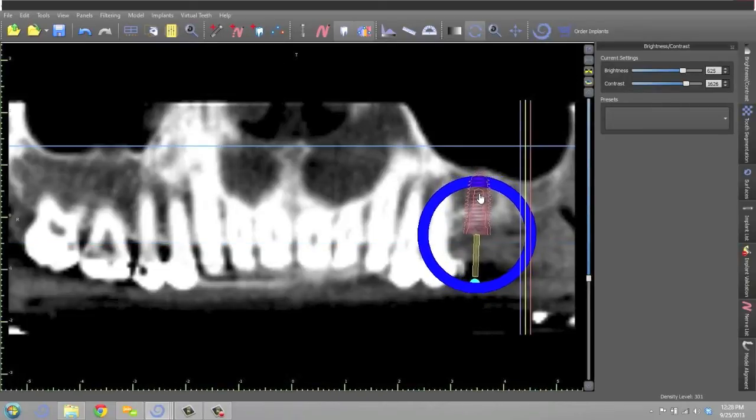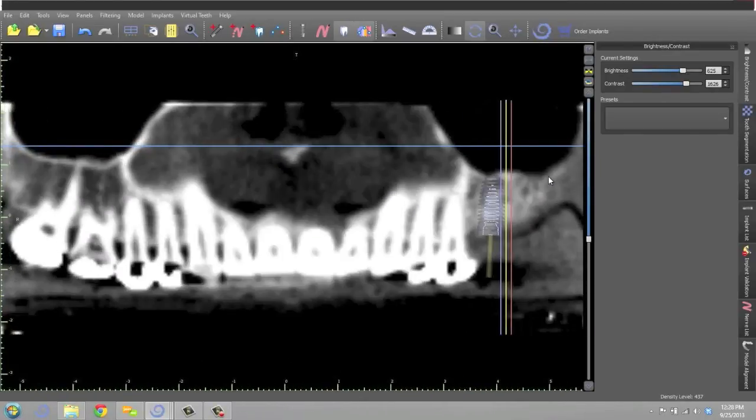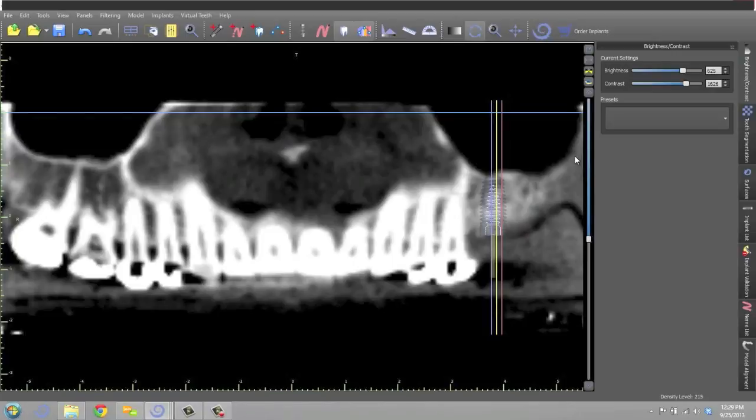And basically what I'm doing here is the cut on the pan I want is the one that shows me the full root, and I'm trying to align my implant with the angulation of that tooth. That's all I'm doing here. Now, in this particular case, we're ascertaining future tooth position by using articulated models. So there's a variety of methods for determining future tooth position, because that's obviously the key to planning. You must know future tooth position in order to place your implant appropriately.